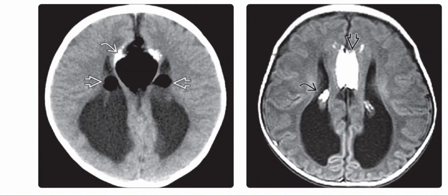Again, the image on the left is the axial non-enhanced CT scan with widened windows, and it shows the agenesis of the corpus callosum with colpocephaly, and a calcified midline lipoma that extends through the choroid fissures into the lateral ventricles. The image on the right is the axial T1-weighted MRI in the same case of agenesis of the corpus callosum, and it shows the parallel ventricles, colpocephaly, and a midline lipoma. Also note that the lipoma protrudes through the choroid fissure.